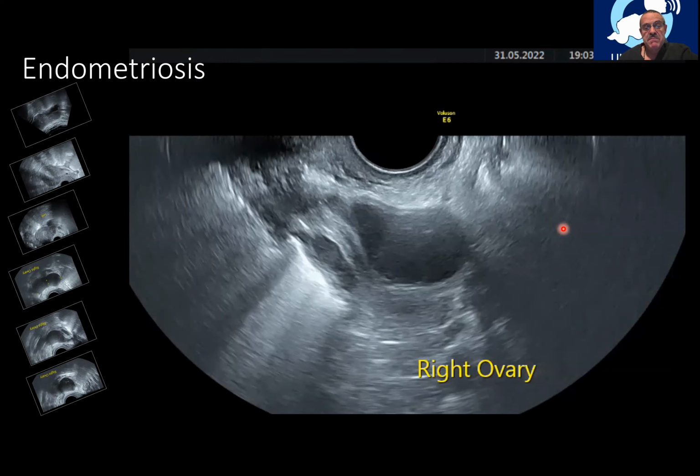One of the great mimickers in the pelvic examination is endometriosis. Endometriosis can mimic anything or can be image silent, not to show much unless we perform a laparoscopy. That's not the typical diagnosis that we can do just by ultrasound imaging. In fact, for staging that, we need laparoscopy.